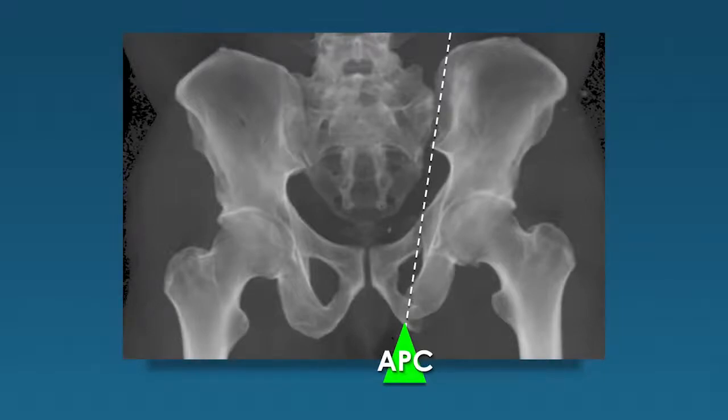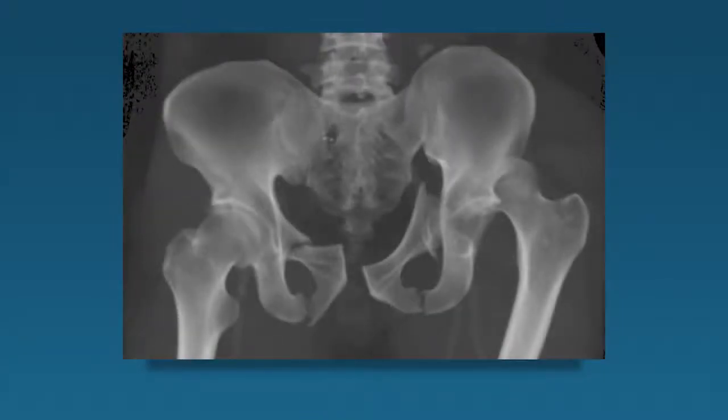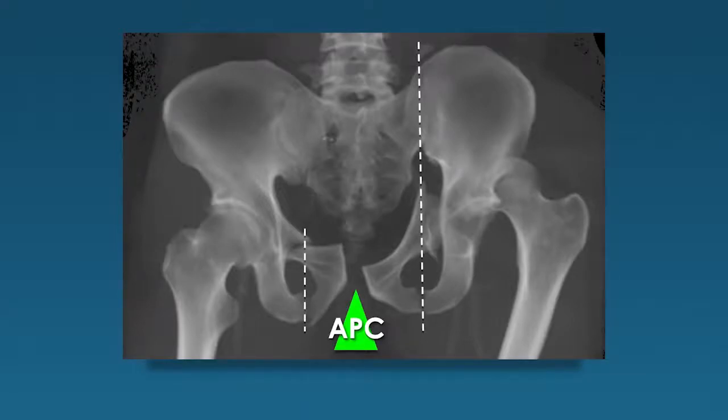Another example here, a little broader force anteriorly, which is disrupting both the symphysis and the obturator rings bilaterally. We see the force going all the way through the SI joints and tearing off the transverse process of L5. To tell you again, we do have posterior injuries as well. We've involved with that broader anterior force the obturator ring injuries on the patient's right side as well. And note the hip. On the left side, posterior dislocation goes along perfectly with this scenario on anterior-posterior compression, type 3 with posterior hip dislocation.